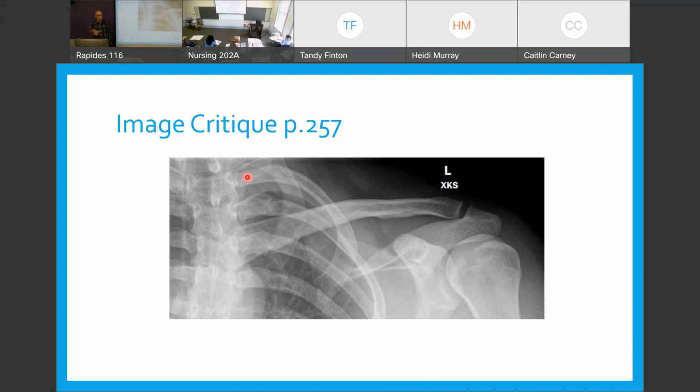It's the only thing in the picture, right? It's got that long collimated field, and we see the articular ends. Now, which is it? Is it straight or is it an axial? It's straight, because it does have this little bit of bend down curve right there. Yes, everybody see that? What's the respiration?